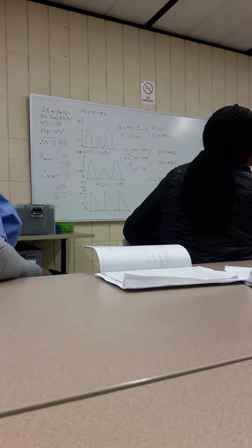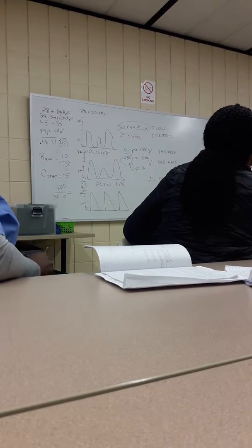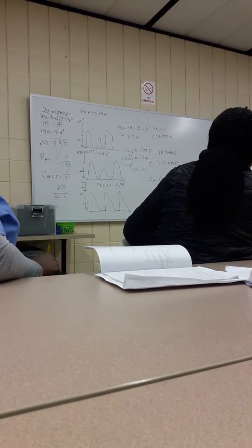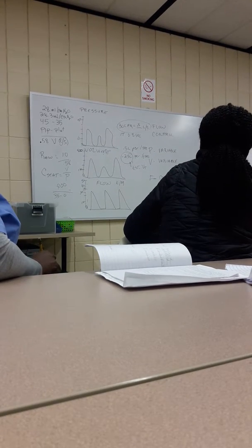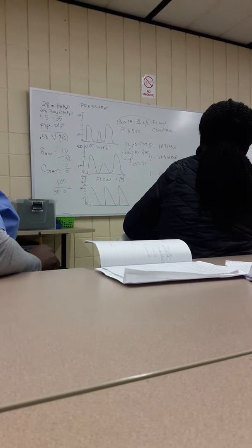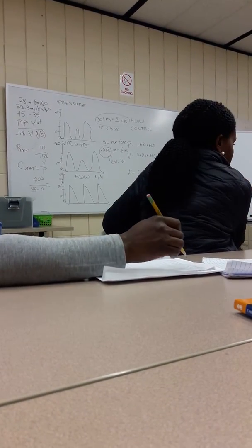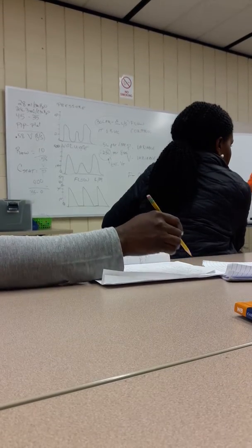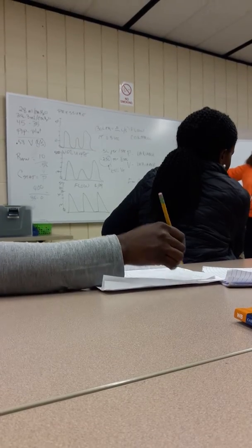Even though modern day ventilators do flow and time, we are really setting a volume, so it's gonna adjust the I time to get the volume that I want. Are we gonna need to estimate that tidal volume? Nope, I don't believe so, not on this. But this is how the ventilator works.